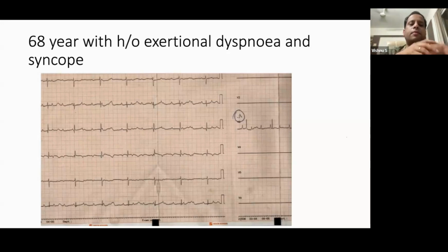From subsequent ECGs, from here we will be seeing some of the complete heart block cases with some clues to the severity of the disease. You will always be seeing complete heart block patients. Some people are doing well even if they're not having a pacemaker. They will have a complete heart block on ECG, and some people, if you try to keep them on medical management, will have heart failure, sudden syncope, or someone dies suddenly at home.